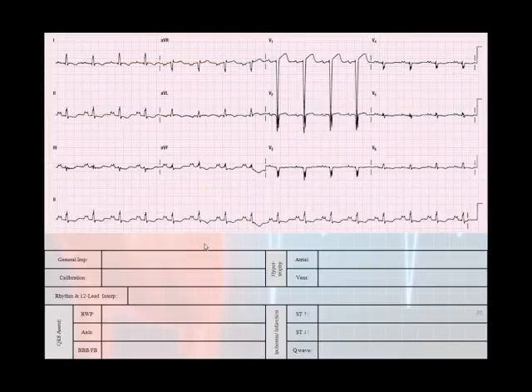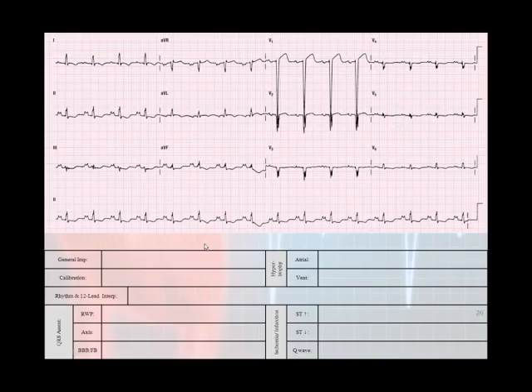Whenever you take a look at this 12-lead, you want to ask yourself, do you see anything excessively fast, excessively slow, or ugly morphologies? When you look at the EKG, a quick glance does not really show anything excessively fast or excessively slow. If you're familiar with what a P wave looks like, you can say that this P wave here is notched, and that's not normal. But does it look ugly? Not necessarily. So you can put abnormal P wave, or you could just put looks fine or something along those lines.